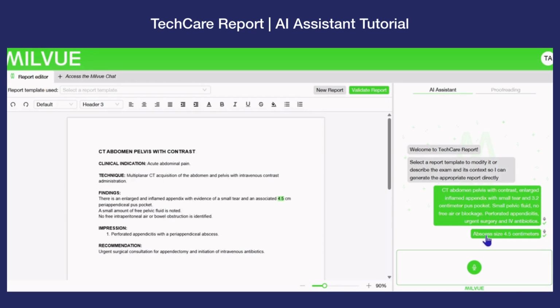In doubt, you can hover over the text message to highlight the modifications. The default input is audio, but you may choose to write your request to our AI assistant in written form.